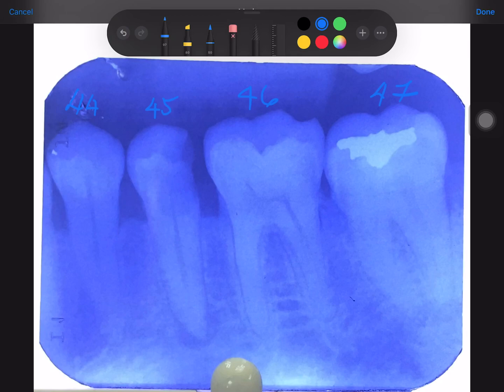So we can see that. What can we see in 4, 5? Let's start with the crown. Radiolucency involving enamel and dentin. If you trace out the radiolucency, that's where it is. Yes, large radiolucency. So what is it? Dental caries. Deep dental caries.